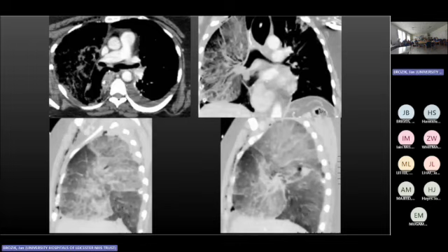We're nearly there. It was hemorrhage. What do you think about the pulmonary artery? It's an infarct. Well, it's infarcted, but the whole lung is infarcted. So a nick in the pulmonary artery causing infarct. Is it clamped? Oh, clear. No. Has it been sutured? No. I should have brought some chocolate.